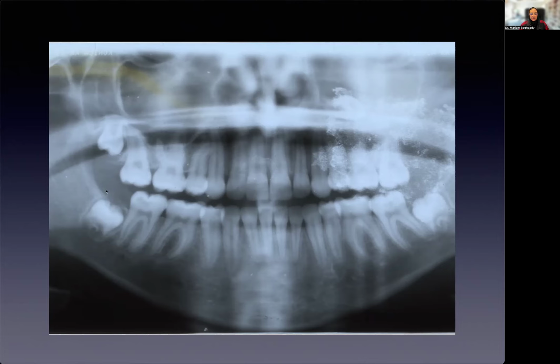So as you can see here, this is a panoramic radiograph that the orthodontist took at the end of treatment for this patient, and they were just basically looking at the parallelity, let's say, of the roots of the teeth after treatment. And they had this big fat artifact on the maxilla here. And they decided that, whatever, it's an artifact, it's not in the area of interest. I'm just going to look over here and everything looks fine. Beautiful teeth, take a picture, go home, goodbye, right?